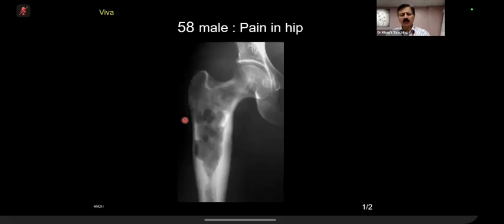And the third thing is the MR criteria. On MR, remember that cartilaginous matrix has high signal, lobulated high signal. If you lose that lobulated high signal, that is taken as a sign of malignancy, but do not confuse it with calcification. The calcification will also be low signal.